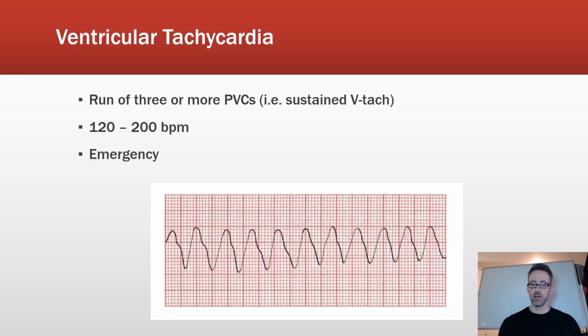And you can see down here, this sort of sinusoidal pattern almost, and this is really the classic picture of VTAC. Now, however, VTAC in certain circumstances can look a lot like a PSVT. However, in VTAC, somebody usually has a heart that's a good bit sicker, whereas PSVT can happen in younger healthy people.